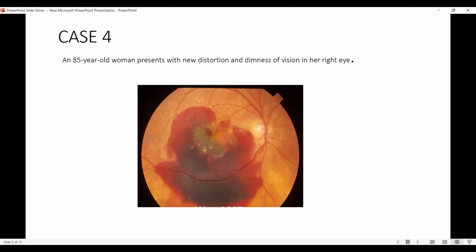What is the modality of this image? This is a color photograph. So in a color photo, can you say that? Oh, yeah, we cannot say hyperfluorescent. So please think about it and then talk, because once you tell something wrong, the examiner can take you the wrong way and it will be difficult. Yes, yes.